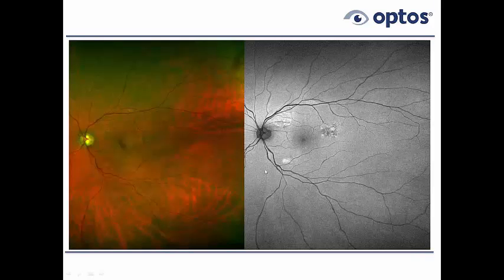Here are the 3 lesions in the left eye in autofluorescence. Let's just show them to you together here, and notice that they're really very, very difficult to see, if not impossible to see, with standard color imaging, but they're clearly there with autofluorescence. We also have fluorescein angiography on this patient and OCTs, just confirming the diagnosis, but we don't really have time to go into that.